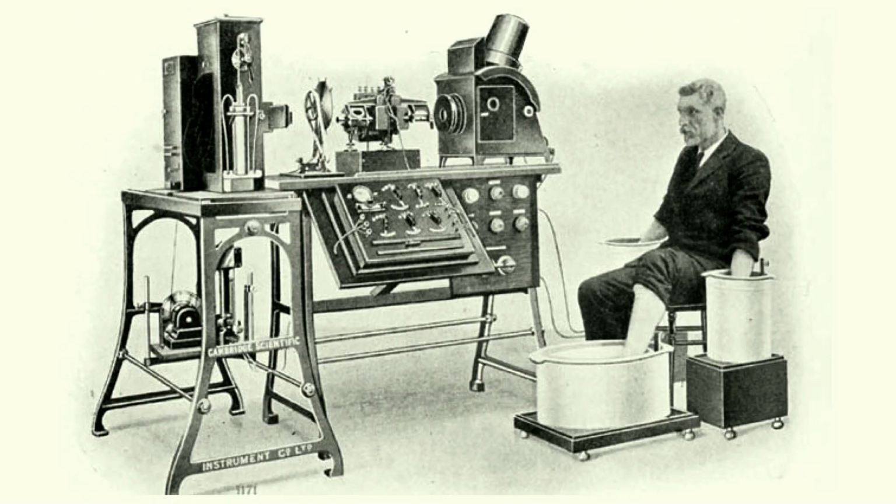Okay, what's this? The first EKG with Willem Einthoven. And this kind of reminds us that which limbs are participating in the formation of leads here? All four of them? No, the right leg is actually the ground electrode, and that's important. Can you imagine how much of a pain it would be if this is still how we got ECGs? And I'm telling you, like, get them every 2 hours. Okay, get the patient down to the basement for ECG. No, but this is the initial ECG by Willem Einthoven, and he has his limbs immersed in buckets of salt water, which allow to record a potential difference across the limbs.